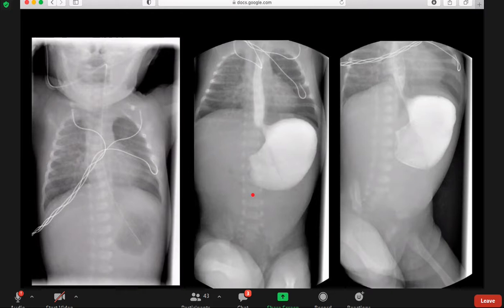However, despite different maneuvers and additional administration of 10 cc of contrast, there was failure of passage of the contrast from the stomach to the duodenum in the small intestine, even after 15 minutes. We could also note the presence of reflux of the contrast into the thoracic esophagus.